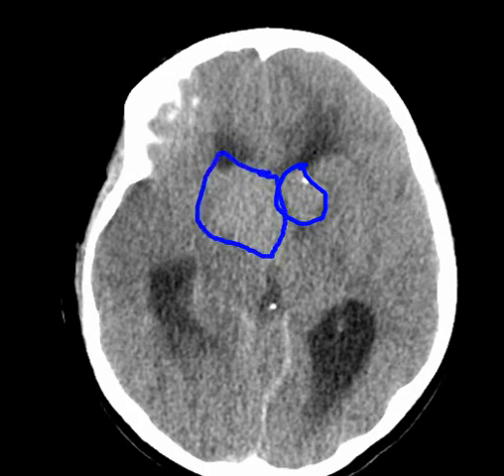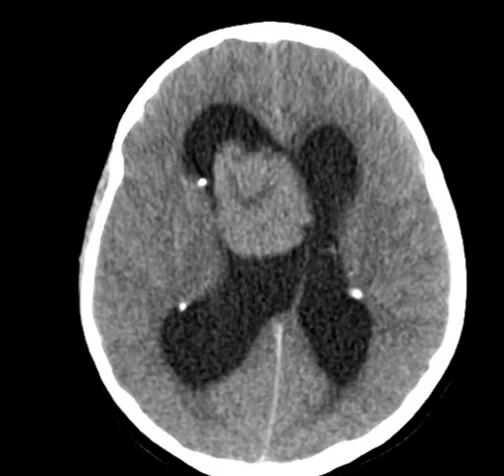So it is post contrast. It is showing enhancement as well. We can also appreciate multiple calcifications along the subependymal locations. These are subependymal calcified tubers. So, calcified tubers in the subependymal location, and masses in the frontal horn of the lateral ventricle, which likely originate from the level of the foramen of Munro.